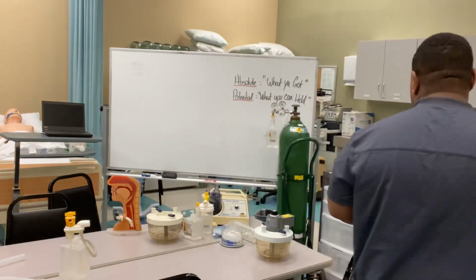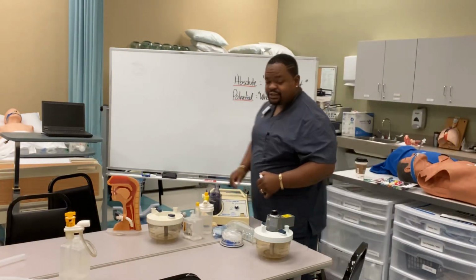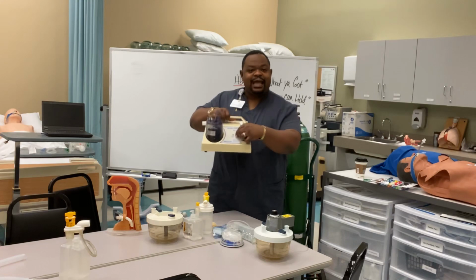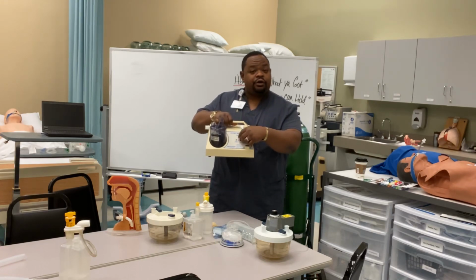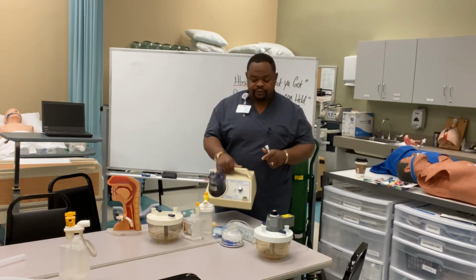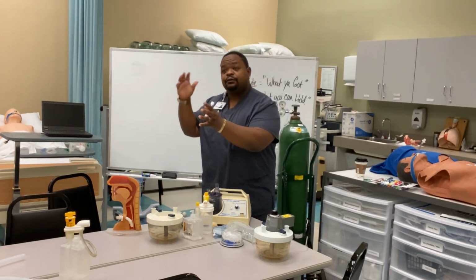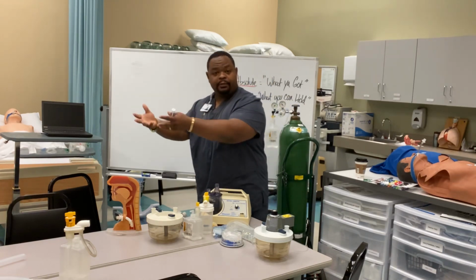Not only that, but it can put out 6 cc's of water per minute. That's the output, right? I can turn it all the way up and it will deliver 6 cc's of that 0.5 to 3 micron mist per minute.